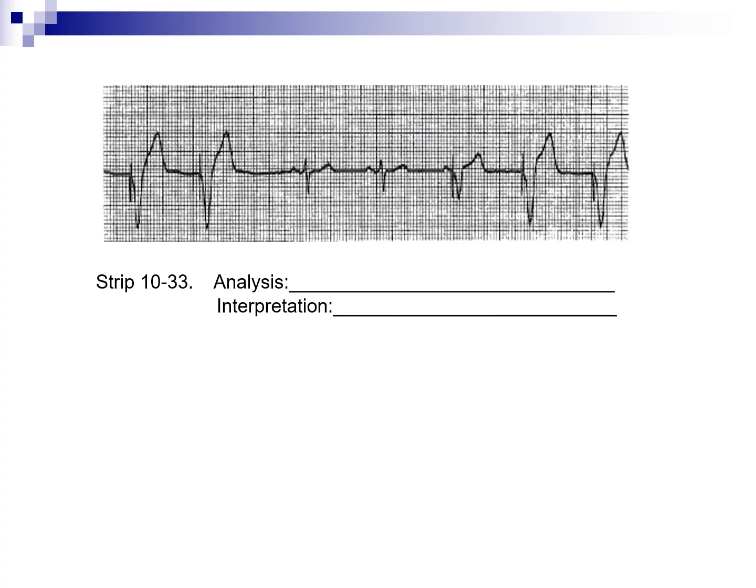And 10-33, this is a ventricular paced rhythm, so two pacer spikes with a QRS, so captured. The patient has their own beat, and then the pacer came in, and what happened here is, again, you have another fusion beat, which is the blending of the patient's intrinsic rhythm and a paced beat, and then it goes into a paced rhythm. So this is a normal functioning pacer, sensing the patient's own beat, coming in on time, and capturing appropriately.